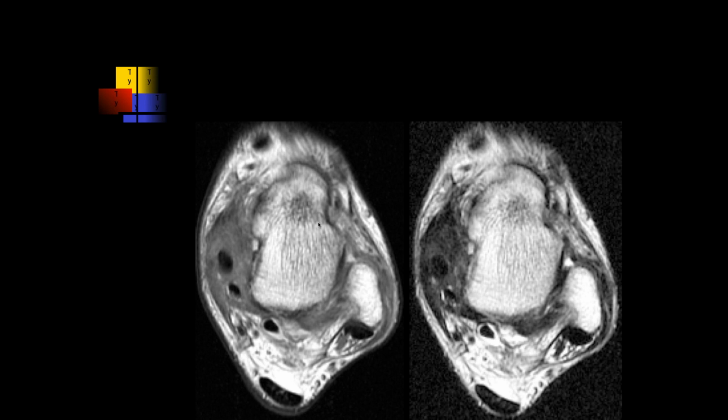I typically eyeball it. Okay, Jennifer, what do you think of this case?